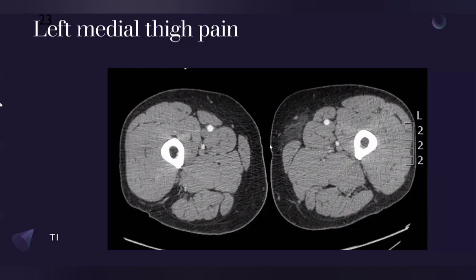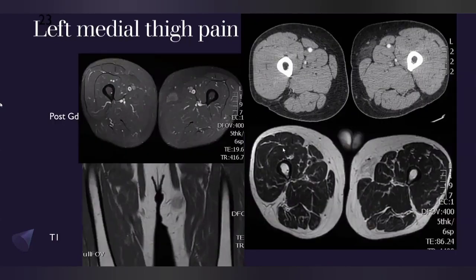The patient presented with some swelling in the left mid thigh, and you saw slight diffuse stranding in the subcutaneous fat here compared to the right side, and there was no enhancing soft tissue mass. The referring physician asked for MR as well to rule out any hidden lesion in the muscles or somewhere else. So we did. Again, diffuse stranding in the subcutaneous fat only, without any mass effect or solid enhancement. So this is a similar pathology to what you can see somewhere else.